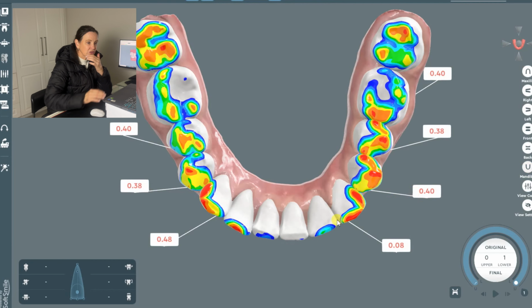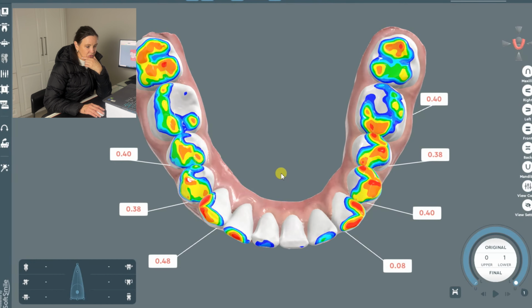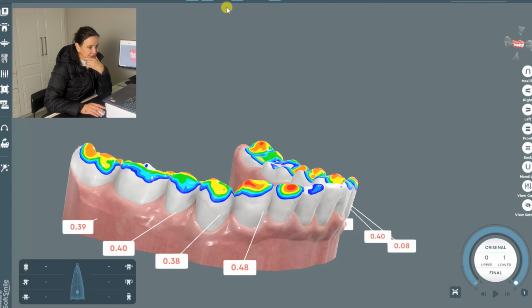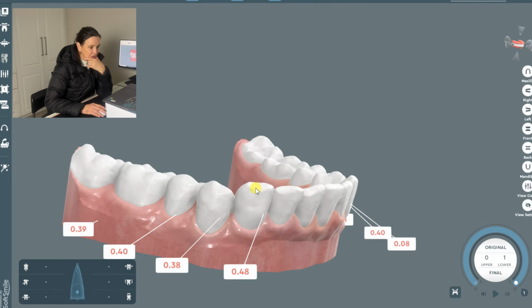So I'm just very, very wary of changing anything in a patient's bite. If I expand, I will always see what type of contacts I had before, how hard were they, and I'll recreate that in the expanded position. Here now we're only doing mandibular stripping, and we're creating a Bolton discrepancy with a lot of unnecessary hard contacts. If the dentist is good and he can go about and do equilibration, I can't tell him.